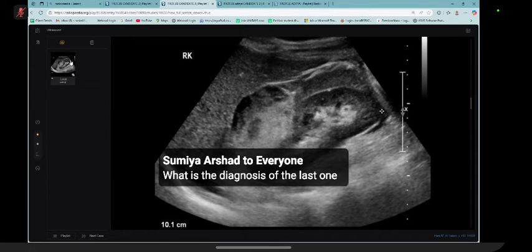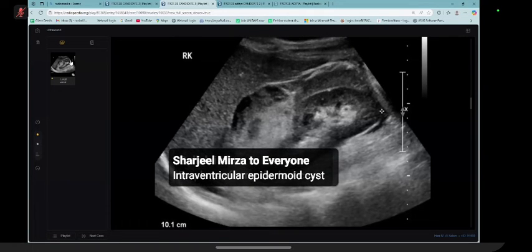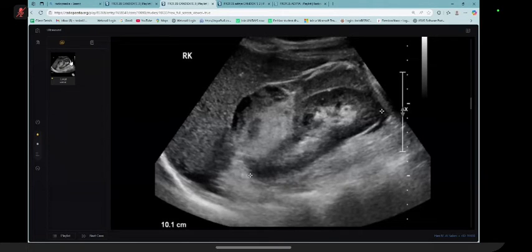Sir, I've been presented with the ultrasound images of the right upper quadrant in which I can see a hyperdense lesion. It is involving the upper pole of the right kidney, and it appears to obscure the border of the anterior cortex of the kidney, with loss of discrimination between the border of the kidney and the gallbladder, and I can see debris within the gallbladder as well.